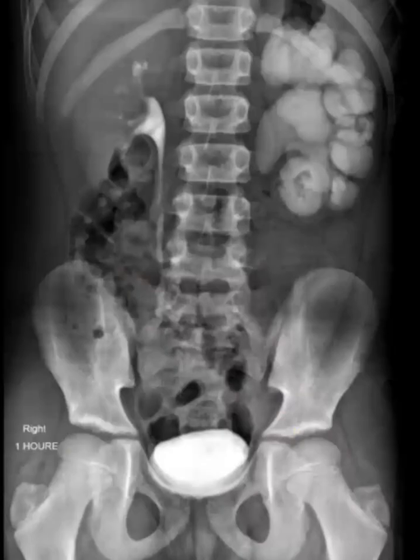Yes, this is another important question. I'm giving you a scenario. A 22-year-old patient has recurrent flank pain, and I have ordered the IVU. Can you tell me the intravenous urogram finding in this patient?